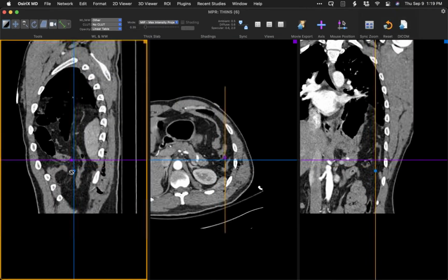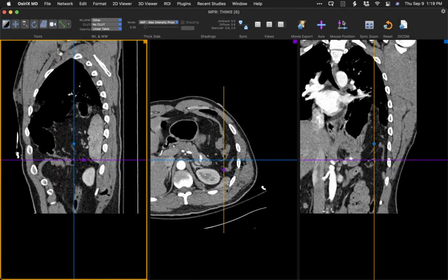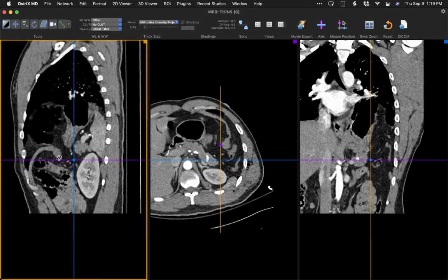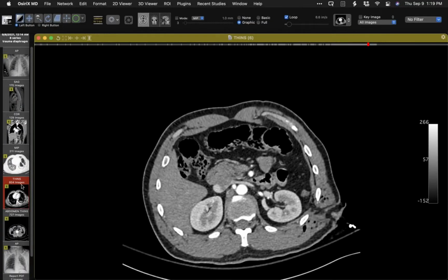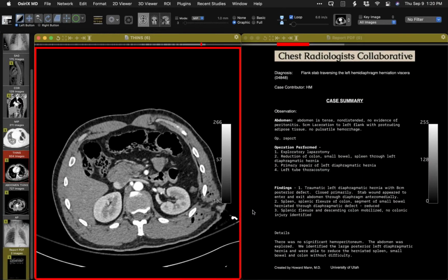So here you can see the intrathoracic herniation of bowel and spleen and fat. So it's a rather large defect. Here is, I believe, the curled edge, thickened but curled edge of a diaphragm right here, and the defect being rather large, going up in this direction. Again, here is diaphragm with the curled edge. So indeed, that is a rather large injury to the diaphragm from the knife wound, surprisingly. And here is confirmation of it. You can see they measured that there as around an 8-centimeter defect.